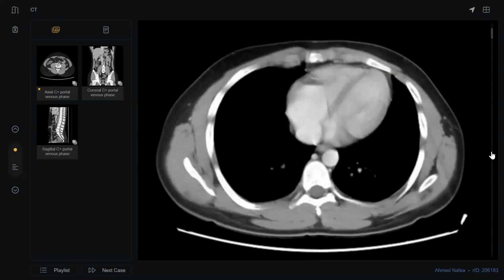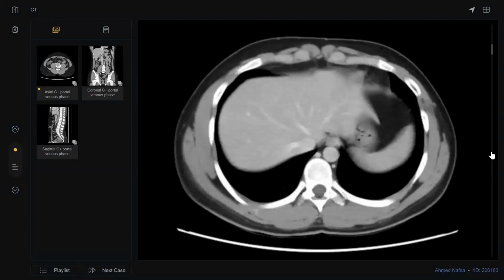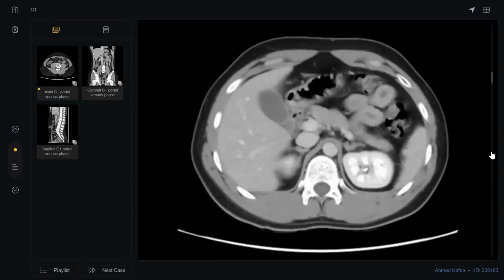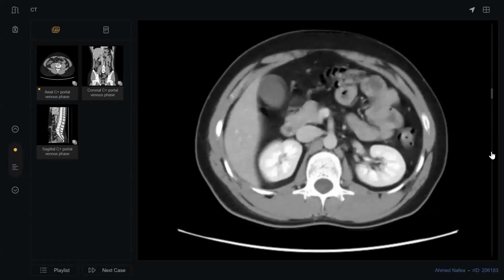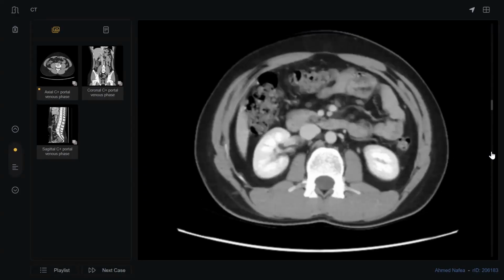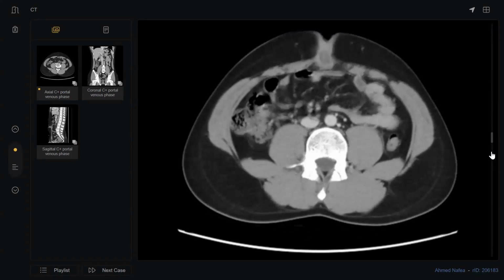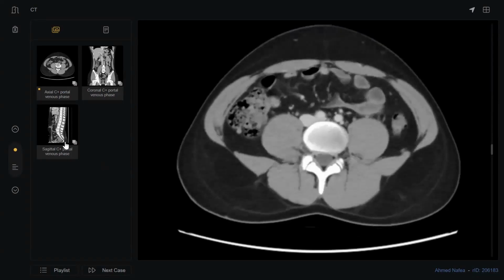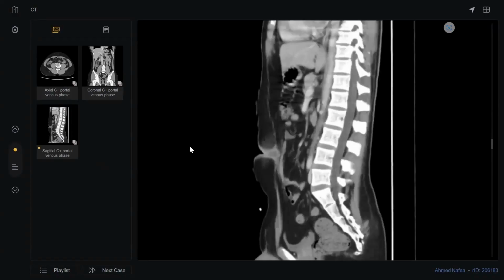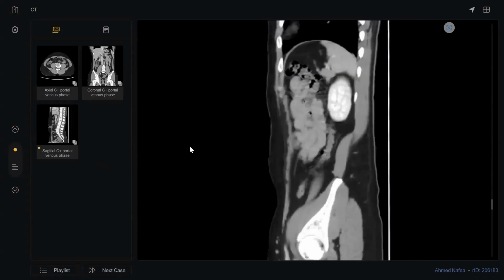By the way, my colleagues, in the exam, all the examiners insist that you must scroll. One examiner for technical errors, really, I can't scroll. And it was the worst exam, worst room for me. So try to scroll, try to do all trials. Look here, my colleague, what happened here? Could you detect anything?